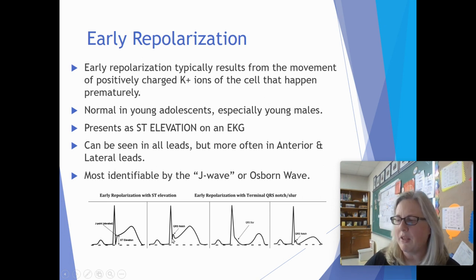Notice that the QRS comes up and then it does this badoop and comes back up. This is a 100% indication this is early repol. Okay. So it repolarized early. Those ions swapped early before it hit the isoelectric line and was able to go straight across.